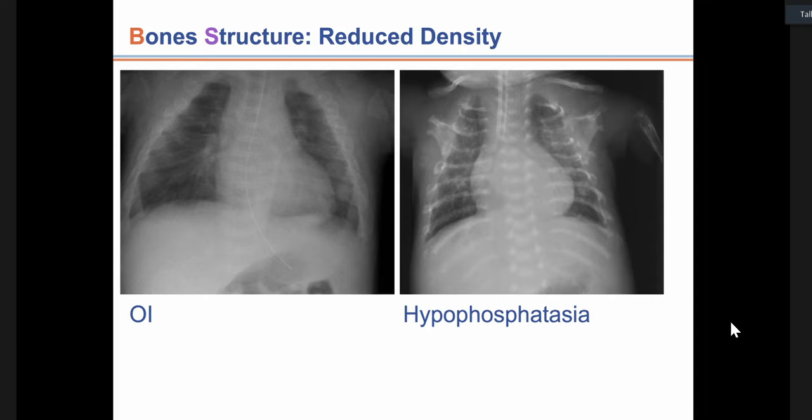When the child is born, they may have broad ribs, as in this example, because of multiple healing fractures that coalesce and give you broad ribs, or you may have slender ribs with beading, slender ribs with focal areas of increased callus that's called beading.